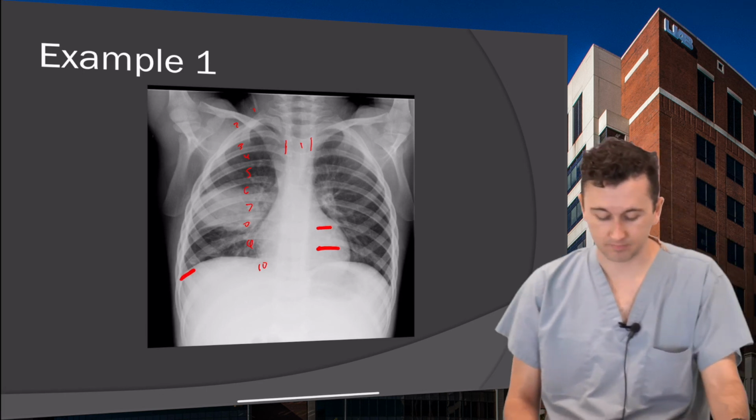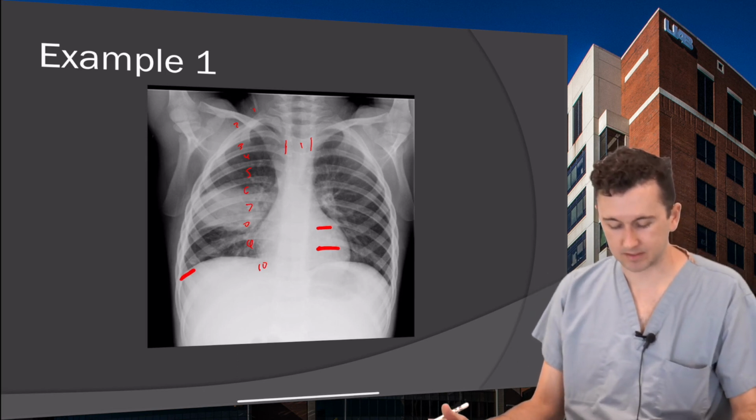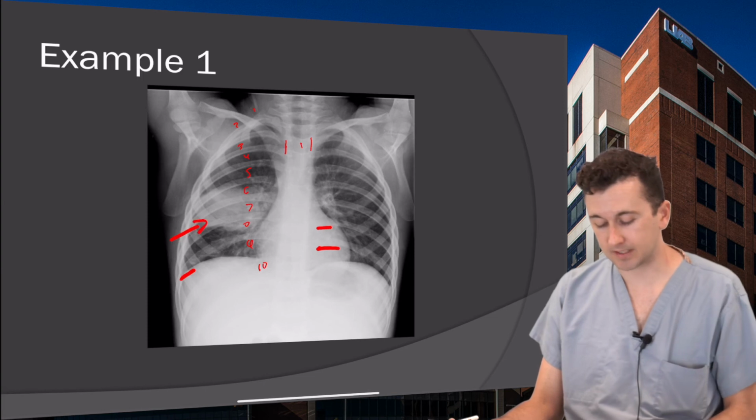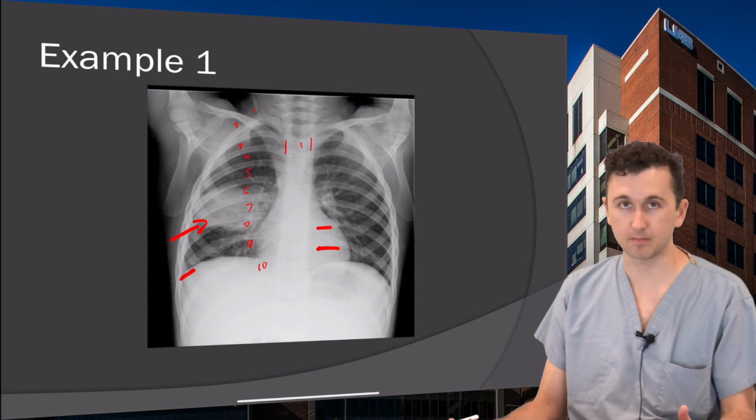And then lastly, our lung fields. He's got this large right-sided opacity that's consistent with the pneumonia. Remember, like I said from the beginning, there's no way you can tell just based off this image if it's in the right lower lobe or right middle lobe. Okay.